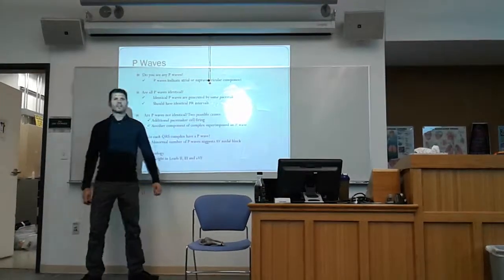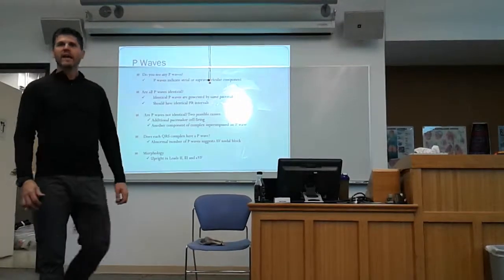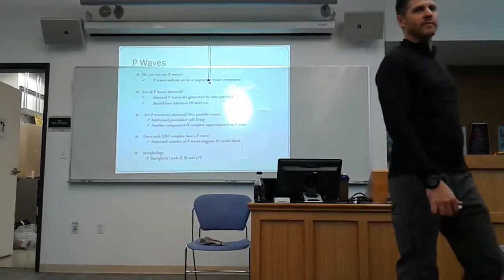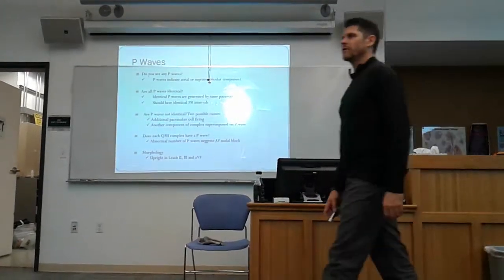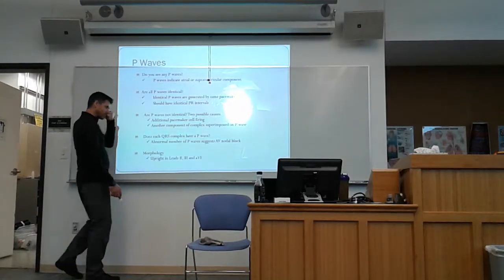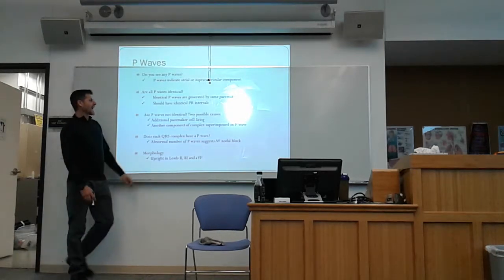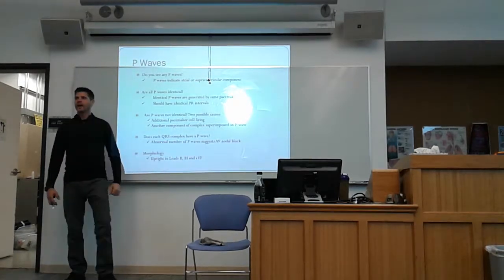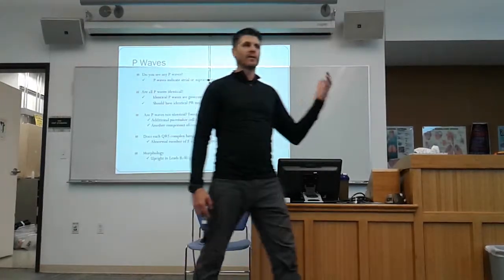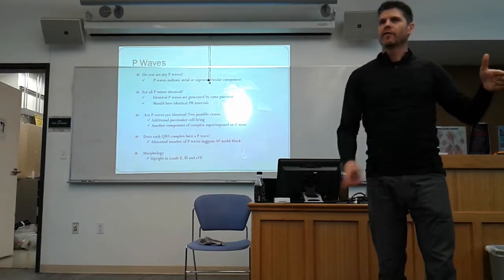Okay, then I'm going to take a look at my P to QRS ratio. Is there a P wave for all of the QRSs? Are there any QRSs that don't have a P wave? If I have a different number of P waves than I have of QRSs, there's a block of some sort in there. There's something that prevented a QRS from coming along with a P.